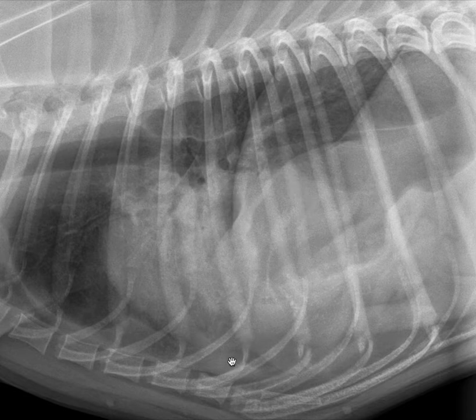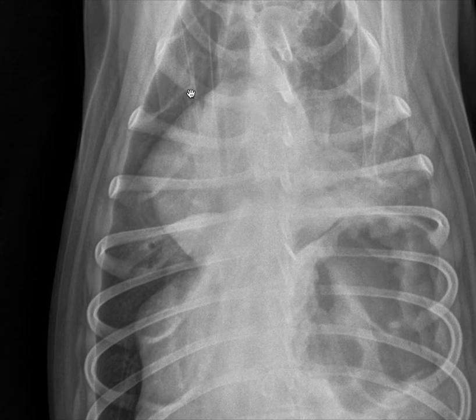I like to start by looking at heart. When I look at this right lateral view, I can see that the heart doesn't appear large, but the caudal margin of the heart is not seen. That's because there's border effacement with all of this soft tissue pathology. I would then quickly check on the other view and see if I have an impression about heart size.